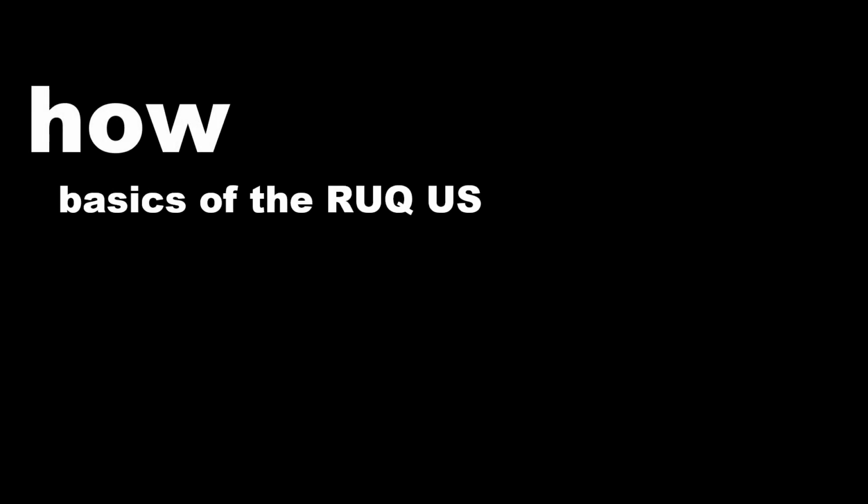In this lecture, we talked about the how. Remember, the basics of the right upper quadrant ultrasound, those 3 different approaches, but that I typically start with that subcostal sweep approach before moving on to one of the more advanced techniques. Don't hesitate. Let your patient take a big deep breath in or roll them into the left lateral decubitus position to really help optimize your images.